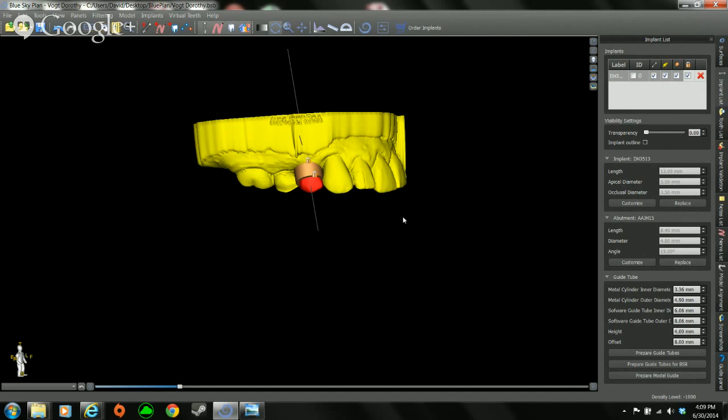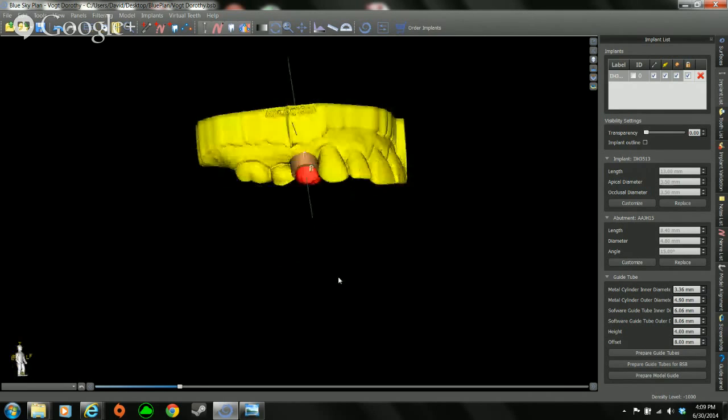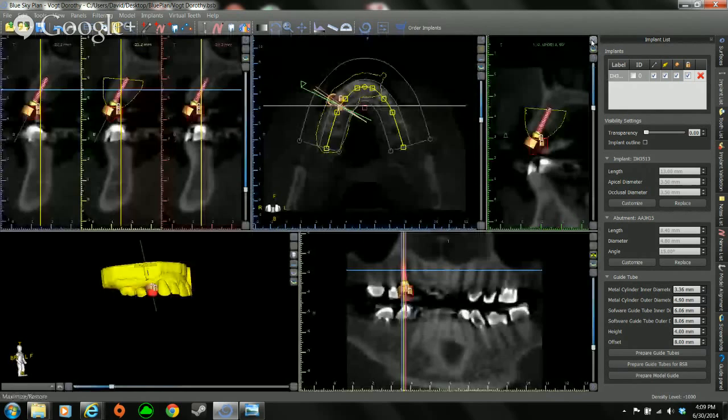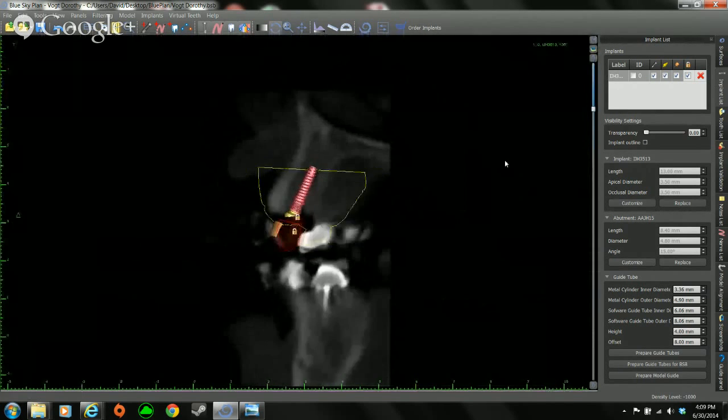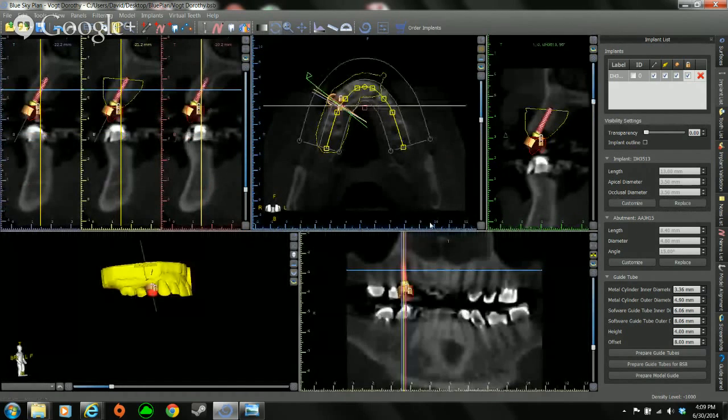So after we've selected the tube here, and we've locked our implant in so it can't move, and we're happy with the plan, the doctors approve the plan. Always have to have doctor approval that they like the position of the implant and the selected implant. We could have gone with a longer implant in this place, but this is fine for this one. Now we're going to go ahead and fabricate the guide. I have the proper ring, the proper offset, implants locked.